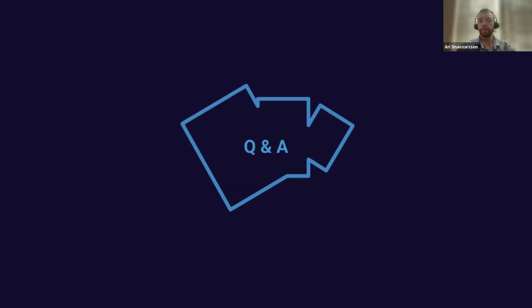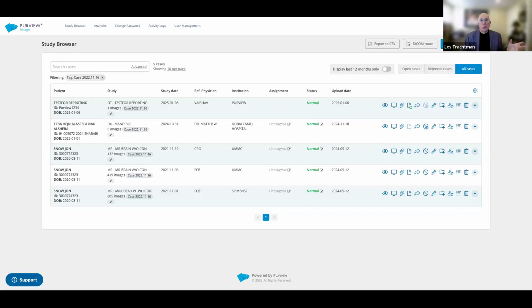Great. And there's a question here just about going over a process that we talked about again. She asks, can you go over the process of uploading the image to the system? I find it takes multiple steps, or maybe that's something I should address with the help desk. We can. Les, do you want me to pop this open and show how it works? Yeah, why don't you pop it open just for a second, and we can talk about it, and we can do it. You did it quickly, which was great, but let's go a little bit slower.